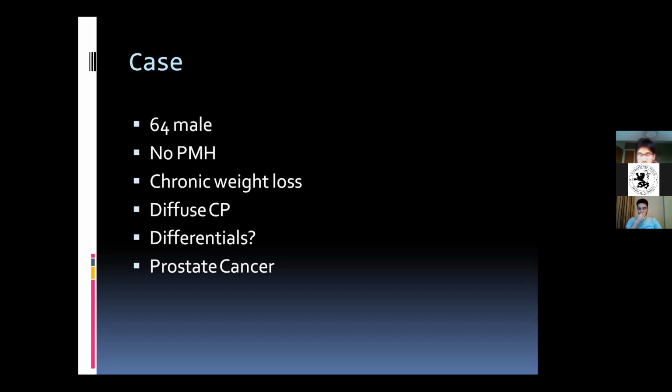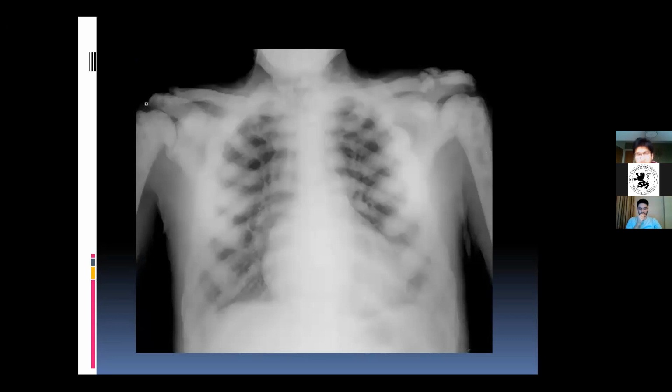So what I'm trying to say is that, yes, you can describe the X-ray as osteoblastic lesions, and there's definite hypersclerosis of these bones and so on and so forth. But the point is that if they are diffuse and they're located in more than 2 ribs, then we really don't know where the systemic condition is coming from unless we have more information. So you can't just rely on the chest X-ray to say, yes, it's one diagnosis.